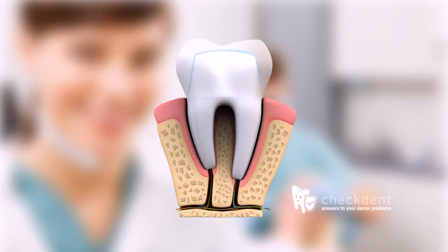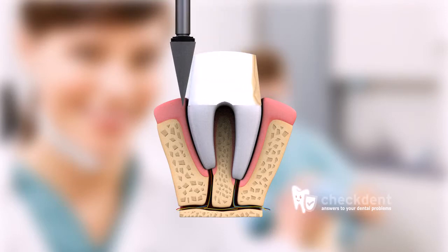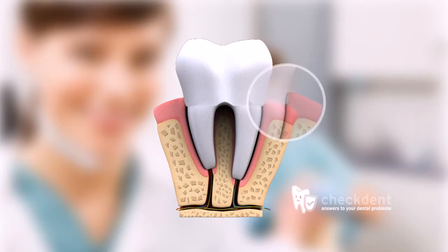The disadvantage of this technique is that the technician has to leave a certain residual thickness of the ceramic while fabricating the crown, otherwise it would break. The result is ugly, overlapping, lumpy edges. In order to hide these, the crown margins are prepared below the gum margin, the gingival margin, because of which a dental probe and/or dental floss can get stuck on the edges of such crowns, as can food particles.